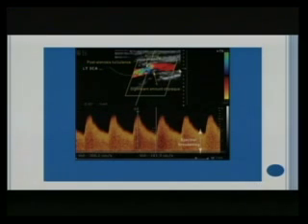Now coming here, and we always speak about color flow aliasing. So color flow aliasing is just a rainbow. It just means that there's turbulence of blood flow. This blood flow is no longer laminar, and it's become turbulent, molecules flowing all over the place.